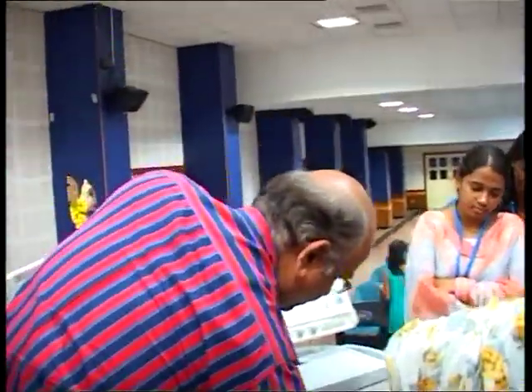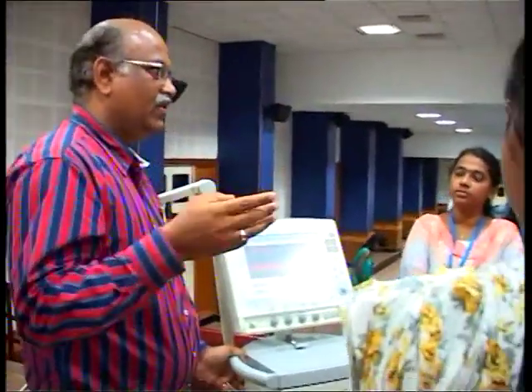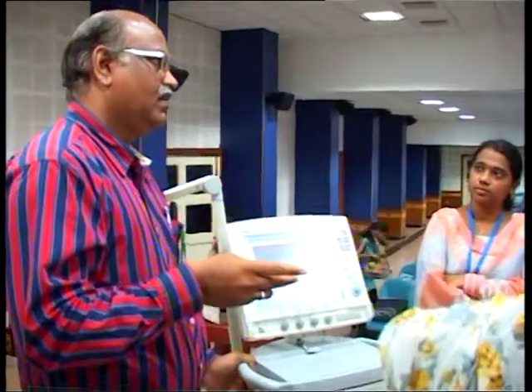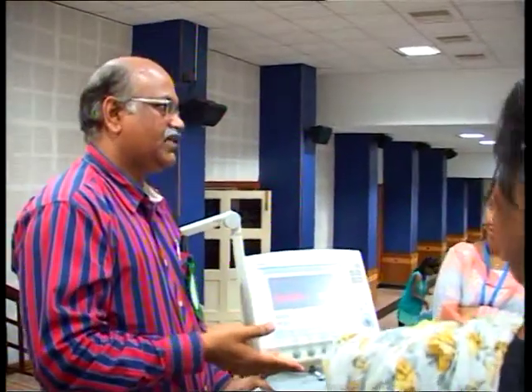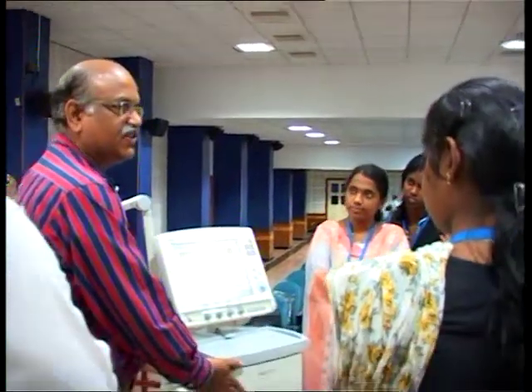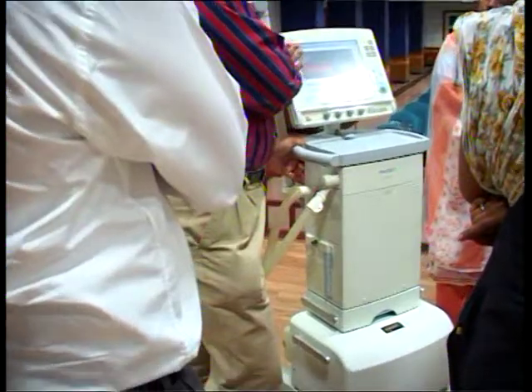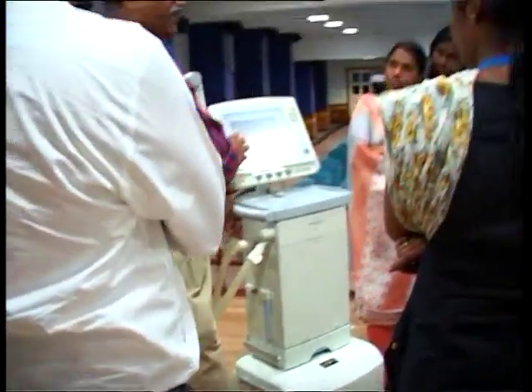So this is the compressor, this is the patient unit. The blocks that I have shown, the pneumatic block, control unit, inspiratory channel, expiratory channel, all of this is inside this. Okay, we will call this the patient unit. And this is the user interface. So whatever input you want to give, you can type it here.